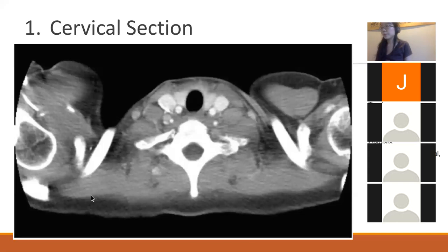So those are sort of our main bone structures, right? And then just by identifying the clavicle, you already know what level you're at. You already know that you're in this area, the heart's down here, you know that you're above the heart. You're not really getting any of the really, really big vessels, like the aorta.